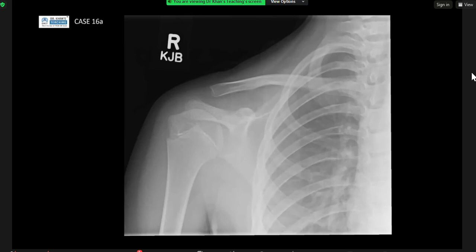Okay, I'm looking at the bone to check if there is any bone abnormalities. I can see a widening at the space of the right acromioclavicular joint. And the right humerus looks good, the epiphysis. The ribs, the trunk. Can I see the right acromioclavicular joint is like there is widening.